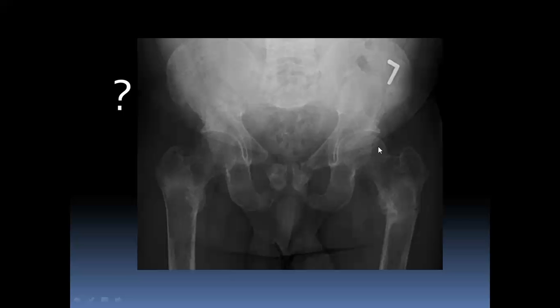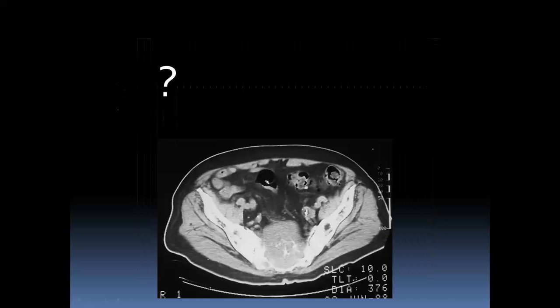This is osteomalacia with a triangular shaped pelvis and multiple stress fractures here and there, bilateral, almost symmetrical, and you can see the stress fractures are involving the supraacetabular regions. Osteomalacia, usually of chronic renal failure, and this one is involving the region of the sacrum.